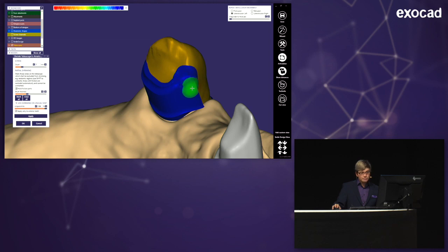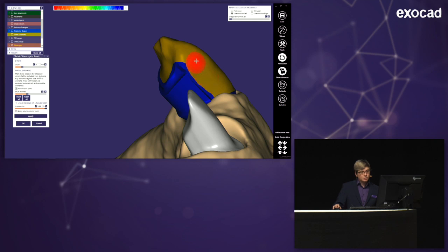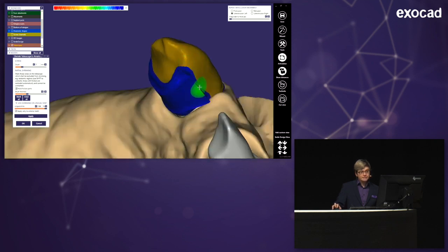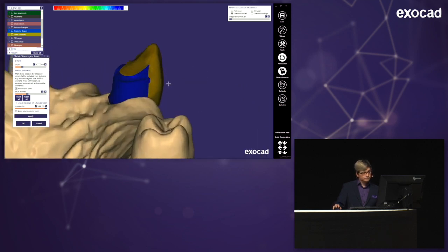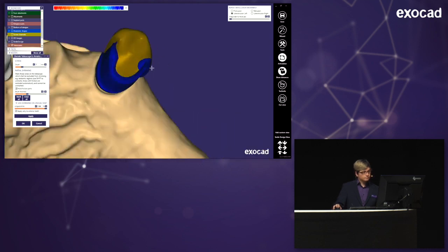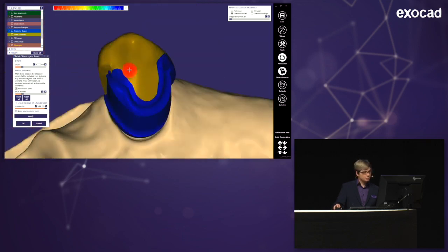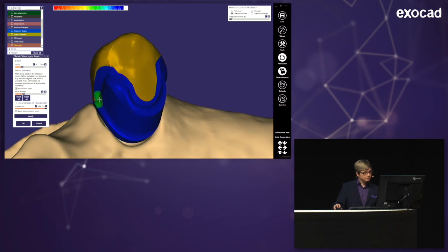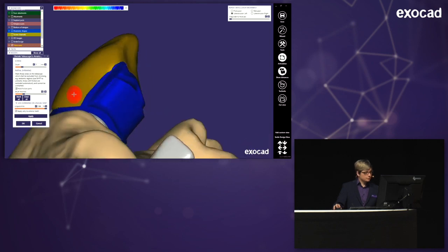How much of that you want to color may actually be based on your milling machine. Doing it just like that for a small gap. So then at the end there will be metal, and the veneering will start here at the yellow color. So I'm doing the same here. As many of you might be aware, if you press the Shift button and scroll the mouse wheel, the size of the brush actually changes, which is really useful in those cases. So for now, this is okay.